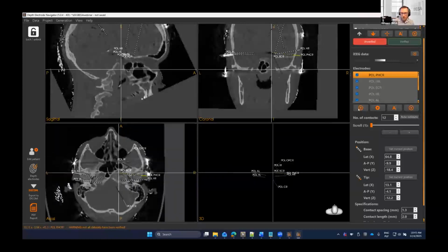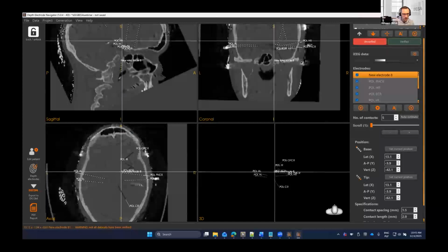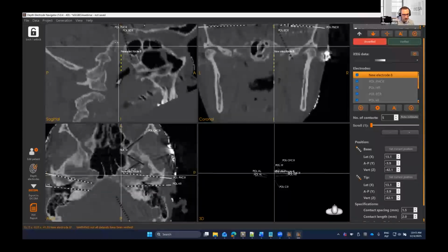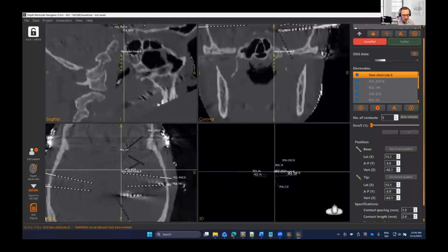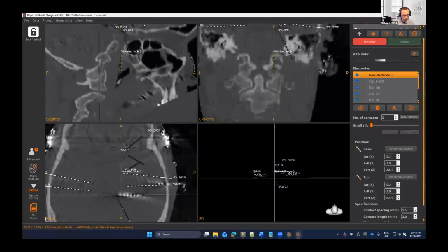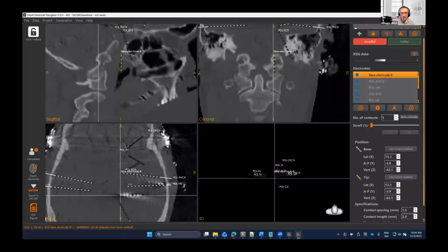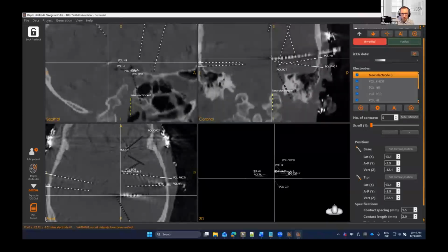Should be, we can just put it here and scroll and try to find the one that goes right here. We almost found it. So let me just mark the pinpoint on it. Let's make sure that we are in the proper spot.